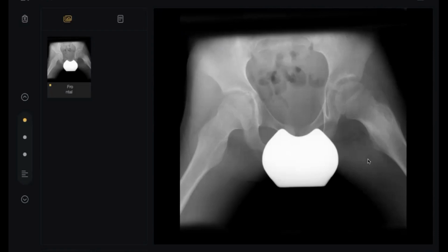I have been presented with a frontal pelvic radiograph, frog view, for a skeletally immature patient with history of left hip pain. In comparison between both femur bones, I can see areas of sclerosis noted within the neck and proximal shaft of the left femur bone in comparison with the right femur bone.